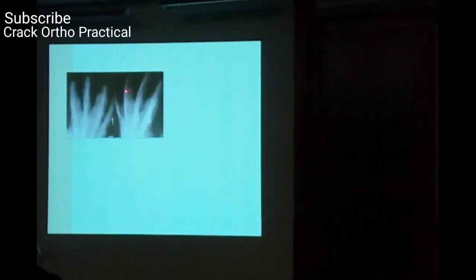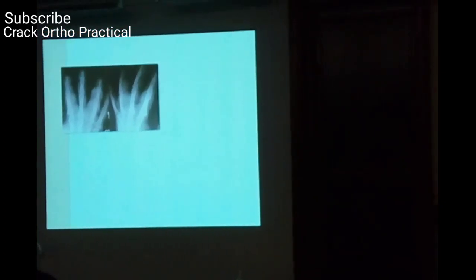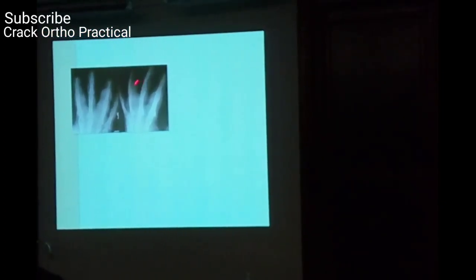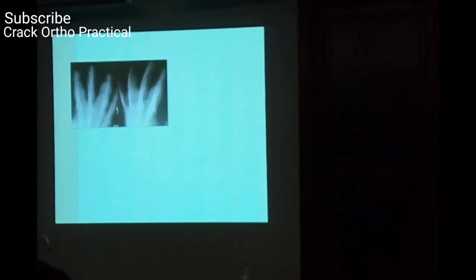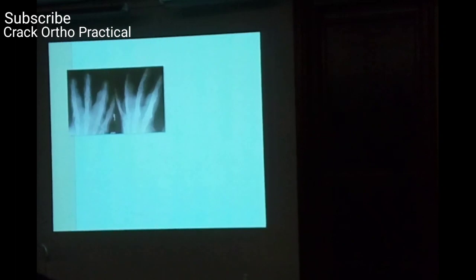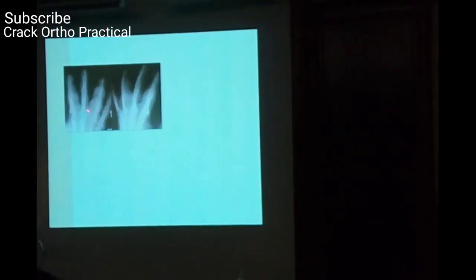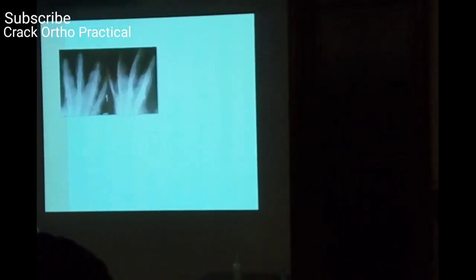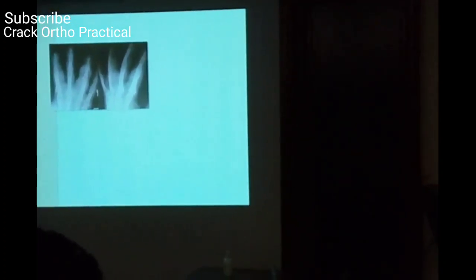Soft tissue swelling is seen in probably all fingers, multiple swellings. No periosteal reaction, no other things.